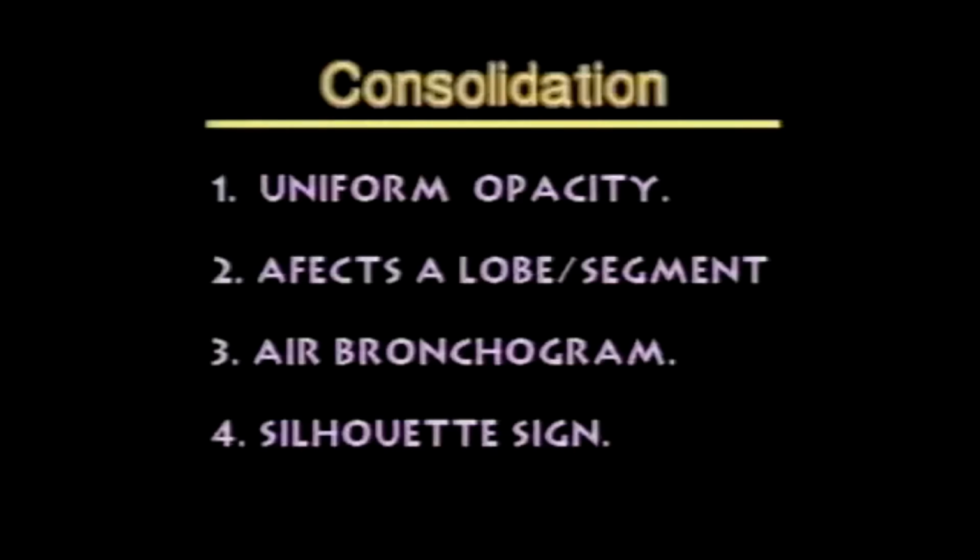So the radiological features of consolidation due to infective pneumonias are a uniform dense white opacity affecting a single anatomical lobe or segment. It may show an air bronchogram if bronchi are patent, and silhouette sign with the borders of the mediastinum.